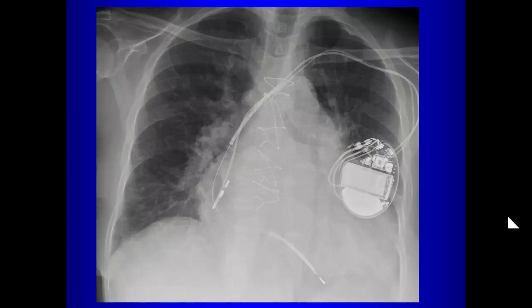All right, so today we're going to talk about abnormalities that you can see on a chest radiograph. So starting with this chest radiograph, we can see that the heart is big. Patient's had a median sternotomy. This is an AICD device here, so it's obvious that the patient has some cardiac issues. There's pulmonary vascular congestion. And when we look closely here in the periphery, we can see these lines that are at right angles to the pleural surface.